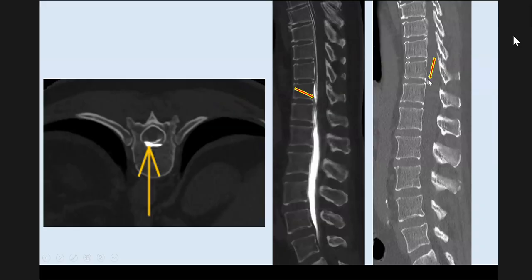And that actually corresponds to this osteophytic bar. There is a disc osteophyte bar here, which we can now say with a good degree of confidence is the cause of the dural tear. So treatment-wise, one could go for a blood patch directly at this level. This may or may not treat the cause, but the definitive treatment would be actually taking this osteophytic bar off and sealing the dura, repairing the dura at this level.